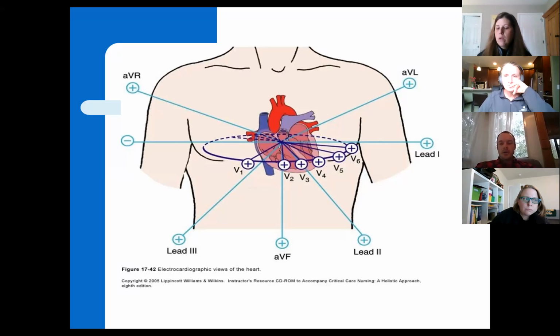So it's important that we get that 12-lead EKG when somebody comes in and says, hey, I'm having chest pain. We're going to get going on that. It's really important. Now, a lot of times you'll see on your monitor strips, no matter if it's in the ED or in telemetry, ICU, a medic truck, a lot of times we look at lead 2. It tends to be the prettiest of all of them most times. It's easier to identify what's going on outside of having a 12 lead. So a lot of times we'll look at lead 2, but not always. Not always.